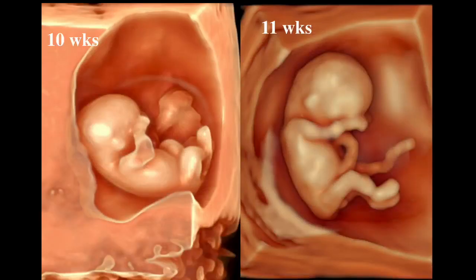So here, 3D, I think, is extremely important in the first trimester. I can't emphasize this enough. There are things that you see on the surface of the fetus that you will not see in first trimester 2D imaging. I think that it's more important in the first trimester than it is even in the second trimester. In the second trimester, you can see quite a bit more detail than in the first trimester. But the surface views of the first trimester are incredibly important.